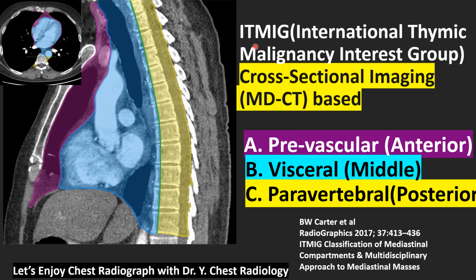Why did the ITMIG, International Thymic Malignancy Interest Group, develop this new concept? Because we are living in the cross-sectional imaging CT stage, and almost anything about mediastinal tumor is defined with the CT, not by the chest lateral film.